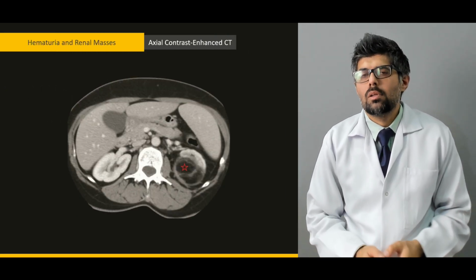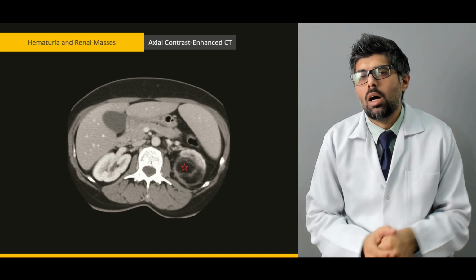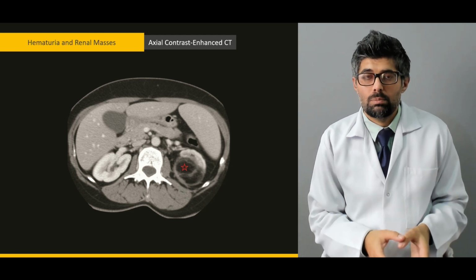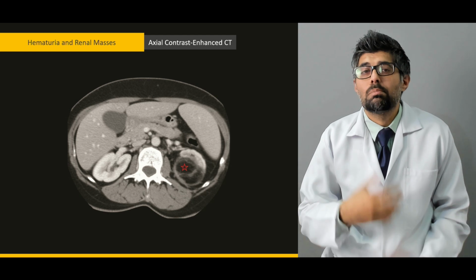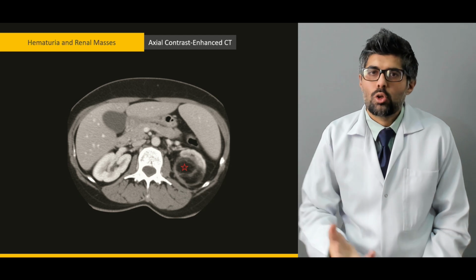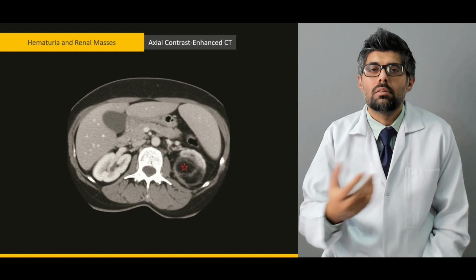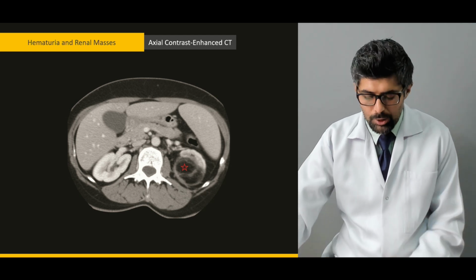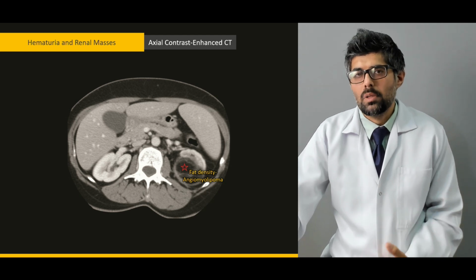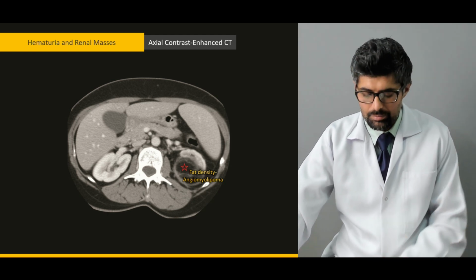Next example that I was talking about. Now, this renal mass is the one I was talking about that has no malignant potential because it has macroscopic fat. It is essentially an accumulation or hyperplasia of fat tissue inside the kidneys. Now, this particular mass is called the angiomyolipoma, and it is never malignant, and it is considered benign.